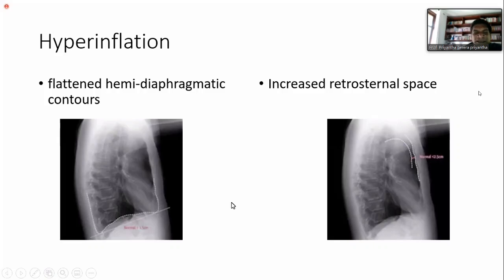The other thing is, if you find air under the heart, usually you don't see air under the cardiac shadow, right? Air under the cardiac shadow could be due to air under the diaphragm, or it could be due to hyperinflation, right? So these are the features that say in the X-ray there is hyperinflation, and characteristically they occur in asthma and bronchiolitis, right? Clear? Any questions?